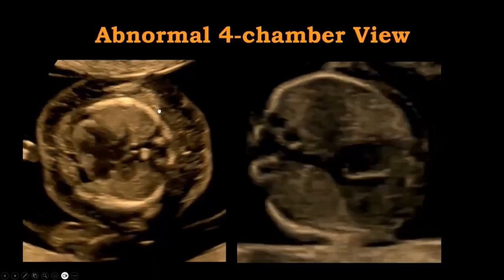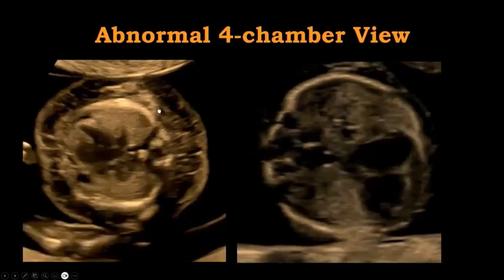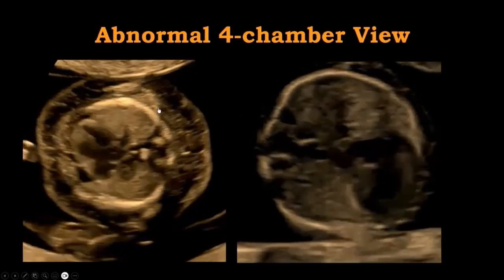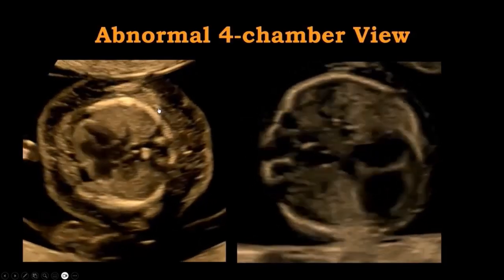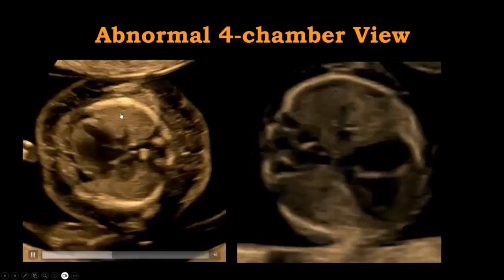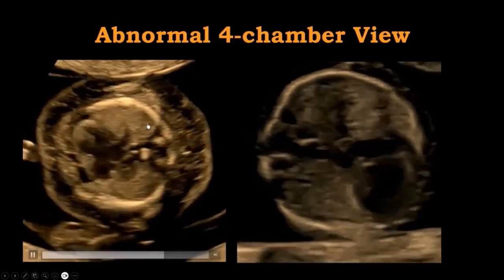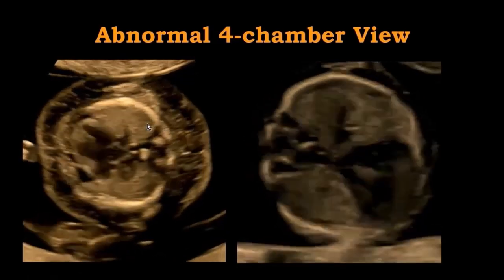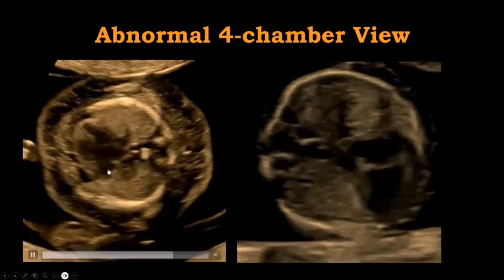Another example: sometimes to improve the resolution, we can utilize different tint maps, and there are plenty for you to choose from. As you know, the tint map makes things look better and with more contrast, because in shades of color we can see much better than using shades of gray.